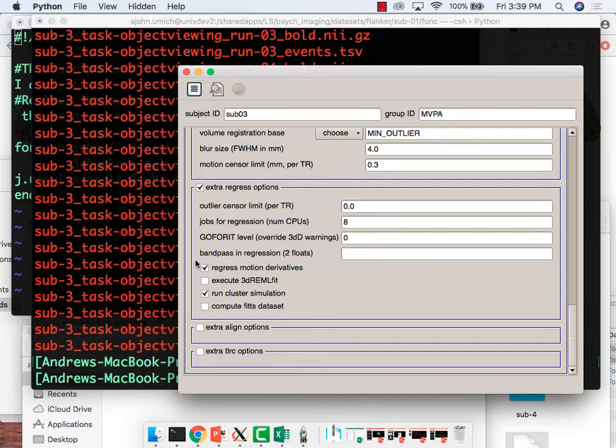So anything we can do to try to account for that is probably good. Okay. I'm making an executive decision. I'm going to turn off cluster simulation because it takes a long time, and with 12 runs, that's going to take quite a bit of time. So I hope you don't mind.